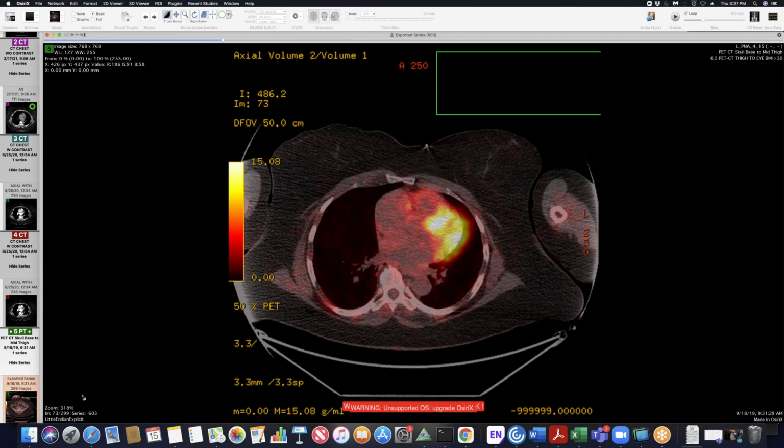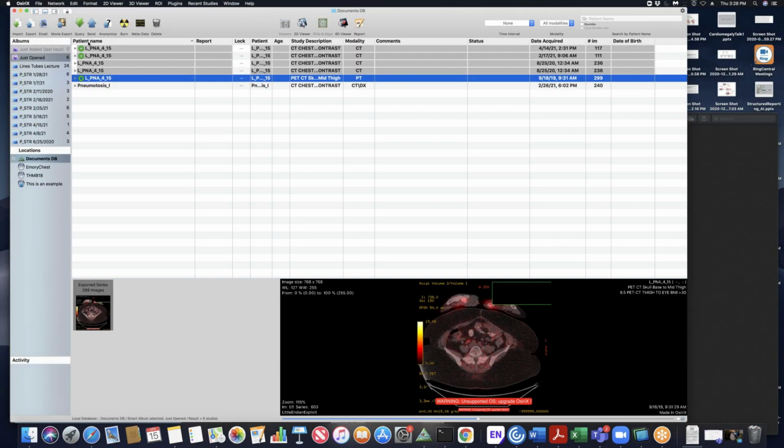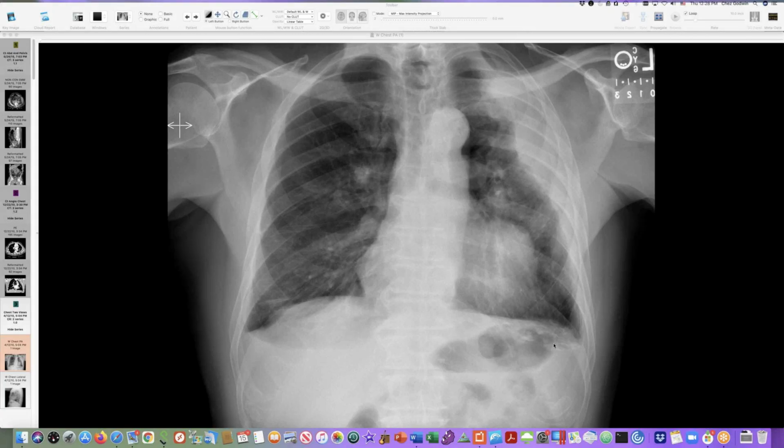But it's FDG negative, so one could say, well, we just watch that guy. Yeah, it's been stable for at least a year and a half. And it's FDG negative. And fatty. I guess if it was a small carcinoid, I feel like that would have some FDG there.